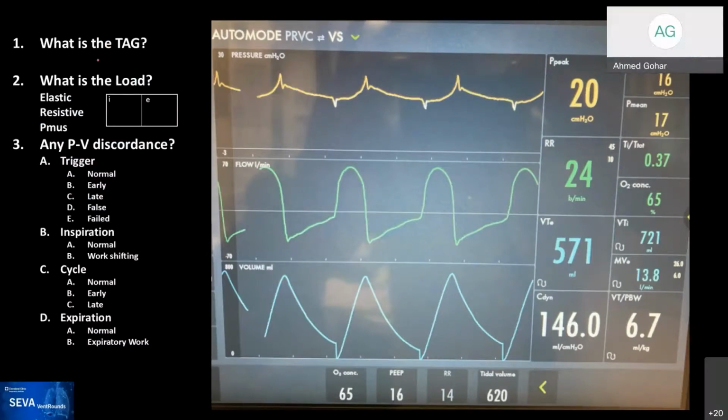This here looks to be PC, and then I'm going to look at the cycling here to the side. I know the mode itself is an IMV, but these particular breaths that I'm seeing here seem to be more or less cycled by the machine.